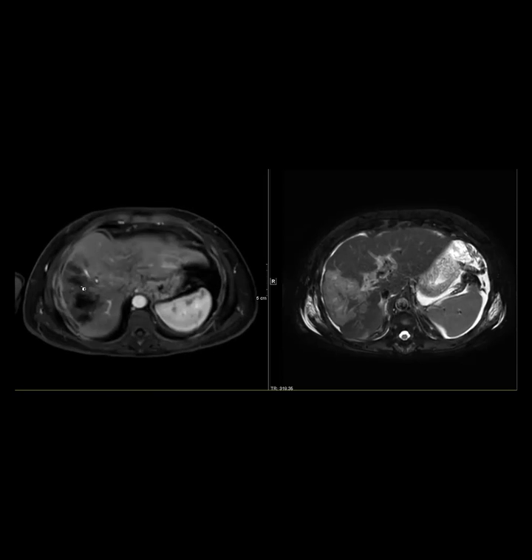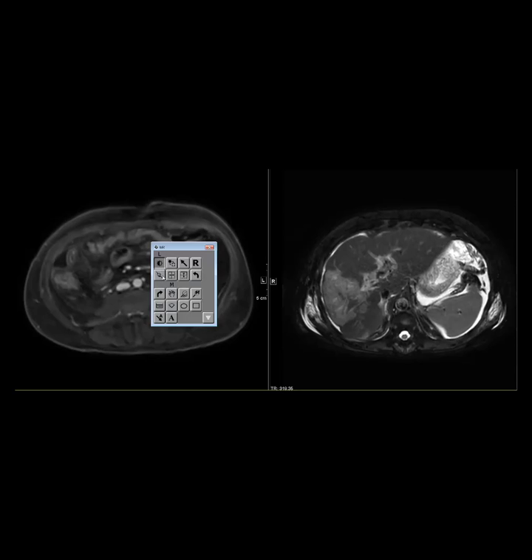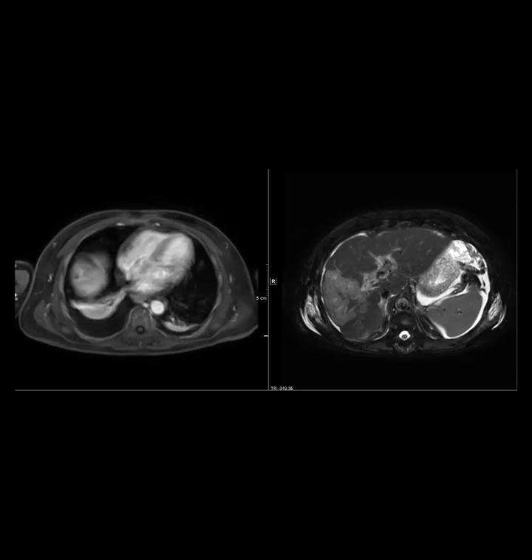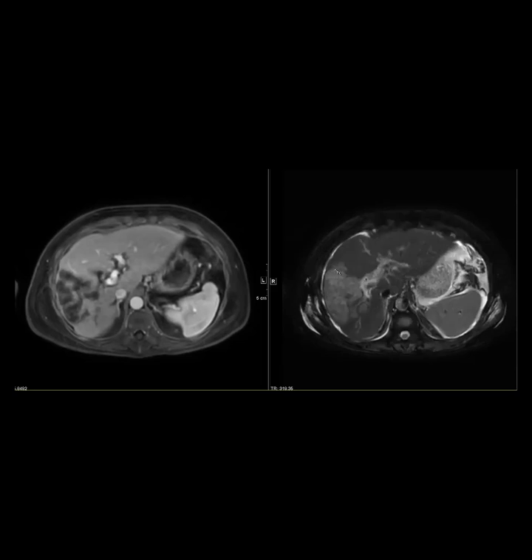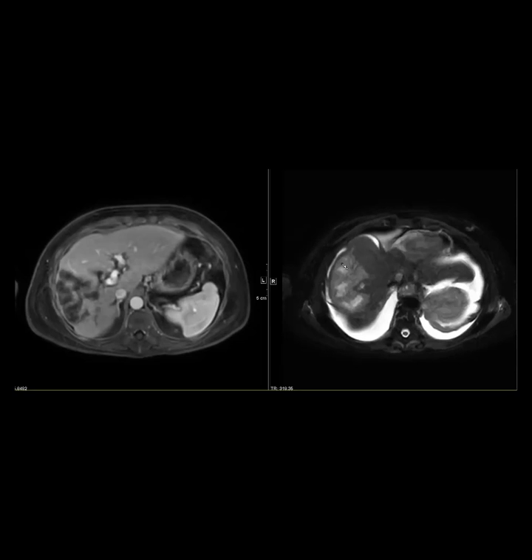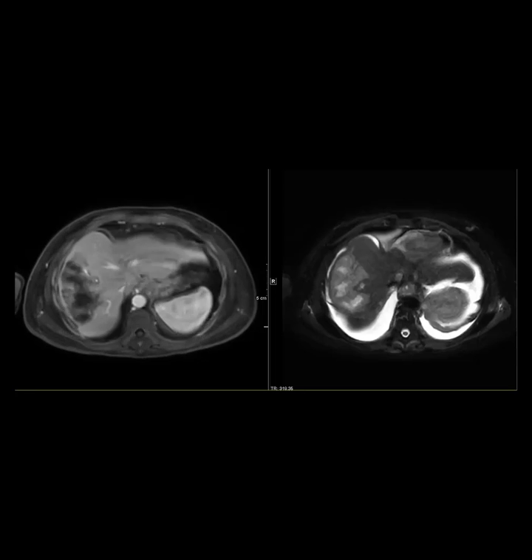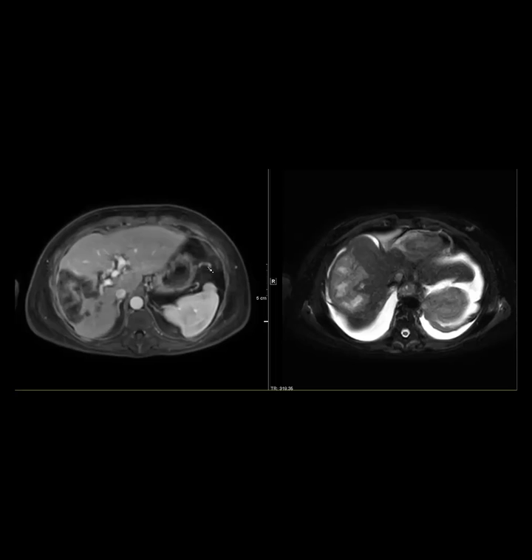And you can see that most of the patient's right hepatic lobe is ischemic. The interesting part here is that the periphery of the affected area has a different signal intensity than the center. I don't have proof for it, but I think that the periphery is ischemic but not completely necrotic. But the center, the parts that are very bright on T2, are fully necrotic.